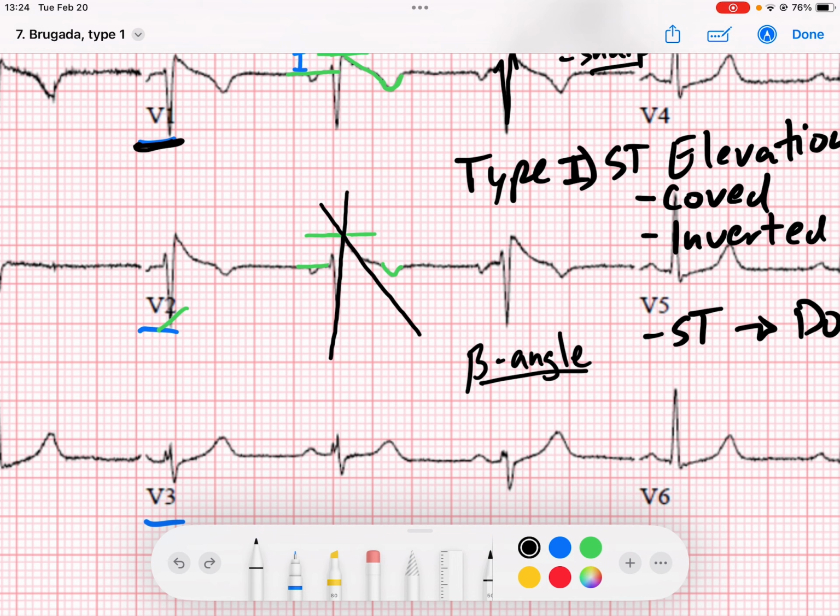So what I like to do is I take from this J point, that's the J point, I will measure 5 millimeters inferiorly from there, right? So we have 1, 2, 3, 4, 5 millimeters. So here's our 5 millimeters. And along that line, we're going to create a triangle, just like so. So that's our triangle that we created, right? And so what you can calculate is the length of the base of the triangle.